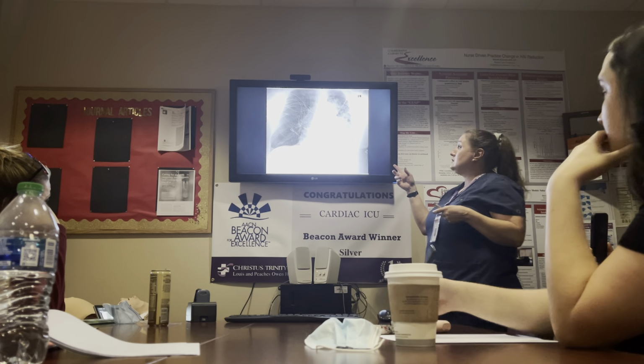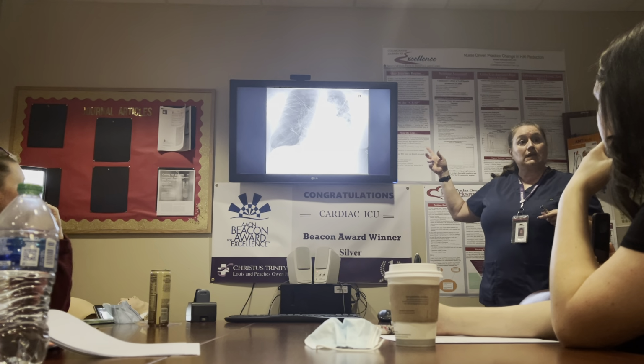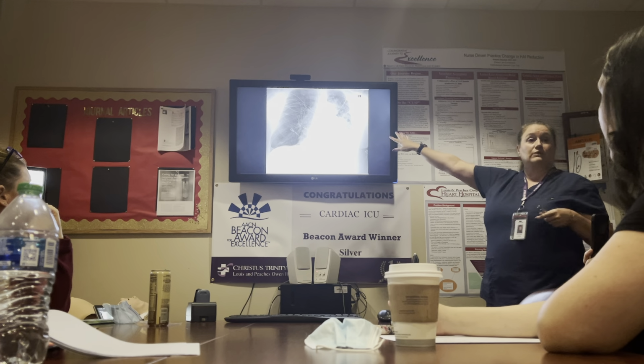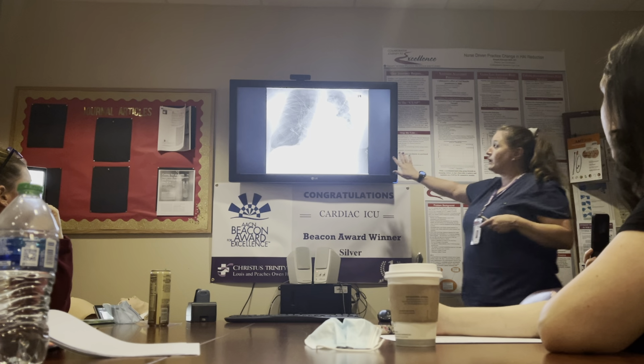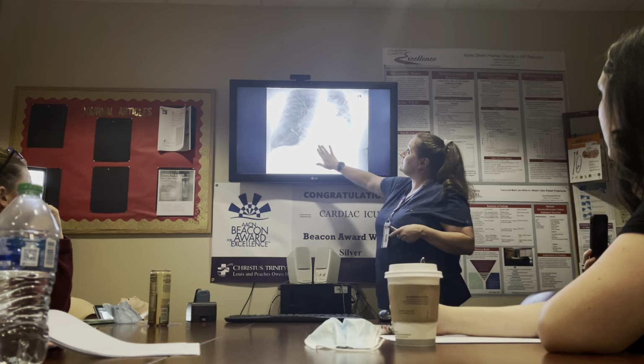And these are patients too that may have had a chest tube in and they've taken the chest tube out, and you want to know whether or not they've developed an apical pneumothorax, and you're not going to be able to see it because it's a poor quality film. It's a little underpenetrated as well because you don't see the vertebral bodies as well.